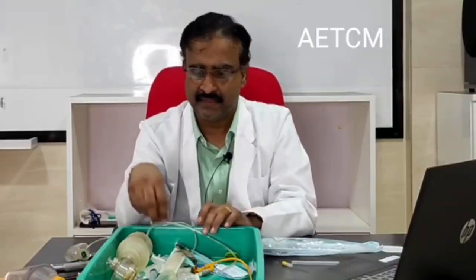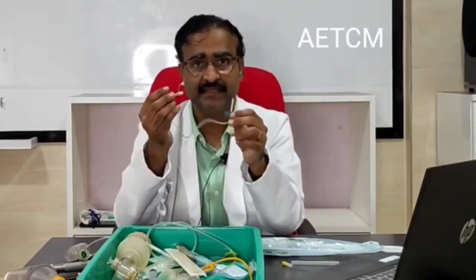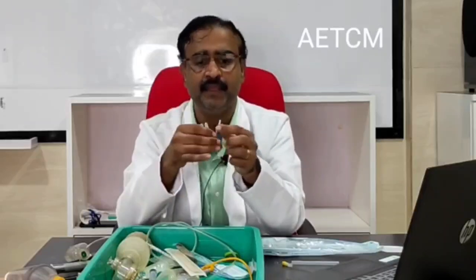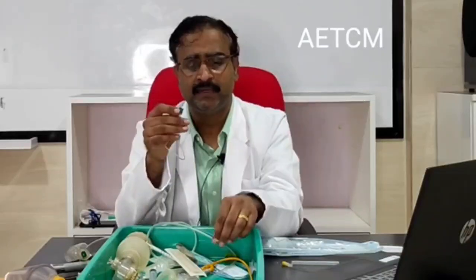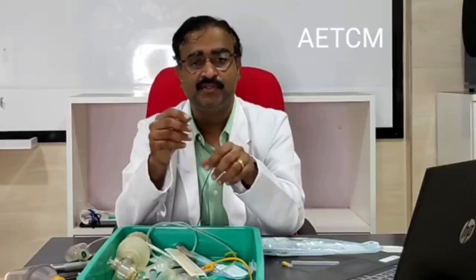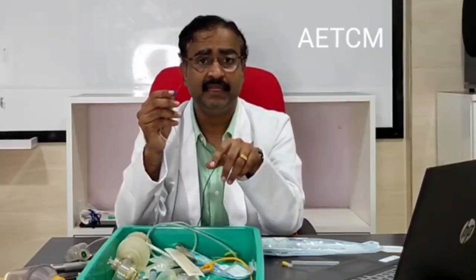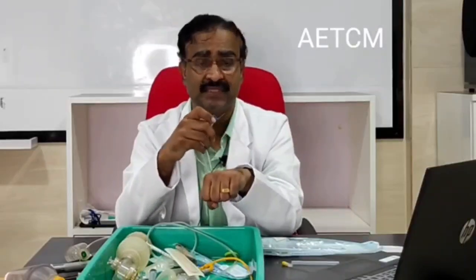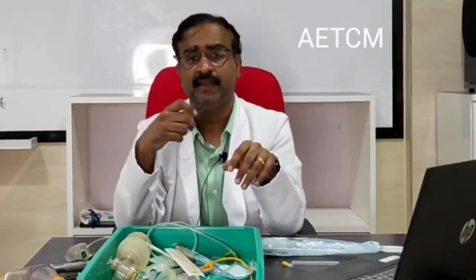The next instrument that I would like to talk to you about is the scalp vein set. This is a very old and common instrument. A few decades ago, this was the only probable instrument available to draw blood and administer drugs. But the problem is that it has a metallic tip. A metallic tip would go through the vessels, in the sense that it would perforate the vessel and the vein would be lost. You would have to find another vein.